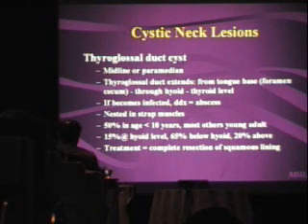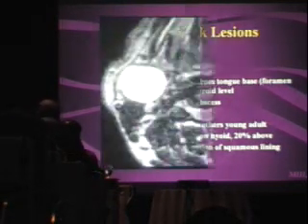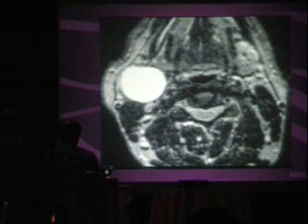Often they're completely asymptomatic until they become infected, and then they balloon out and become clinically obvious. All right? Here's another pretty much Aunt Minnie, but there are 1 or 2 very important things in the differential here. So if you could get the anatomic location on this one, this is probably what?